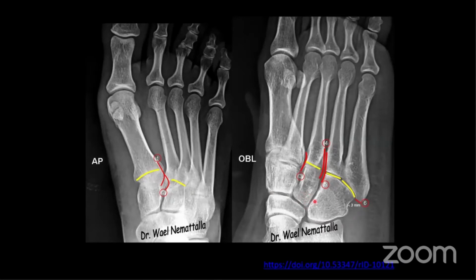As a rule of thumb, all of these spaces should look about the same. In a young person without osteoarthritis and degenerative disease, it's the same principle as the wrist. All the midfoot joint spaces should be about the same width.